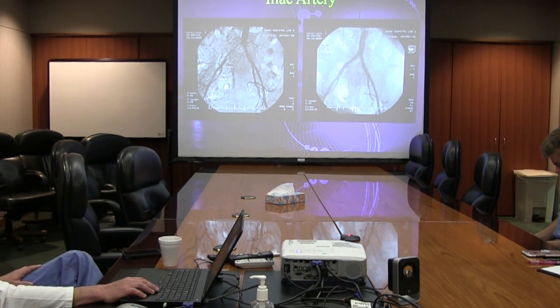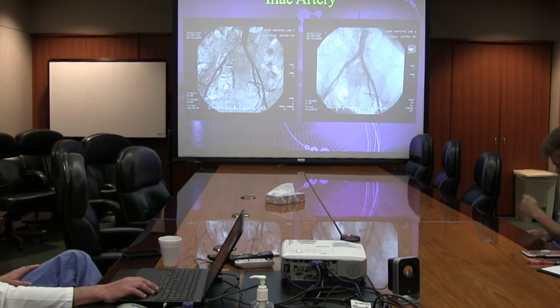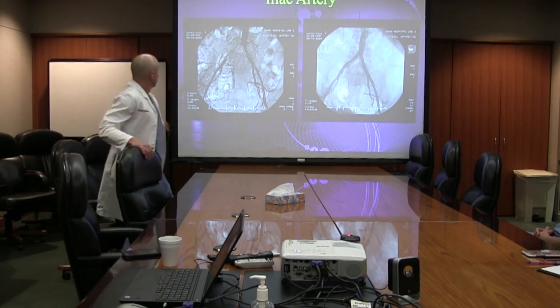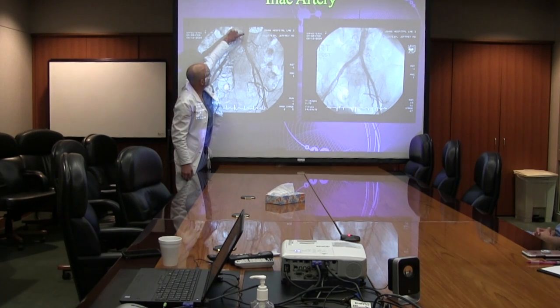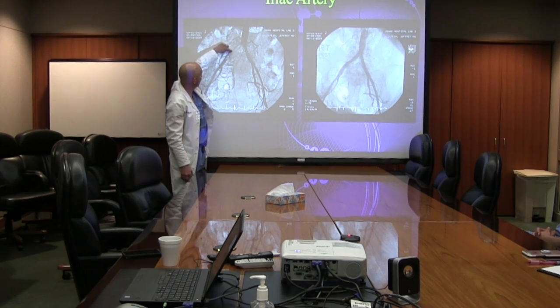We'll just skip ahead. You can see, this is an example. On the left, going back to our anatomy slide, there's a high-grade stenosis in what artery? Don't look at the top. So we got the aorta, the right iliac. Yeah, so the right common iliac.